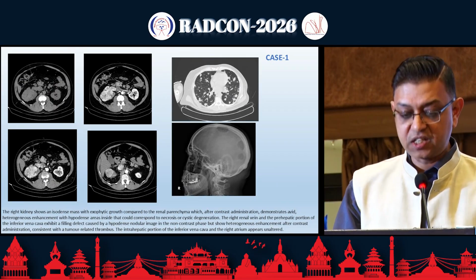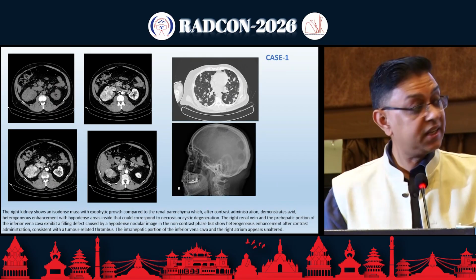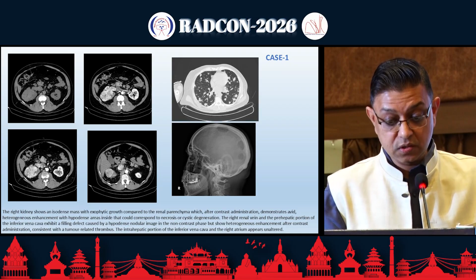That's a case of advanced clear cell carcinoma. Unenhanced images. Oh, you cannot see my marker.